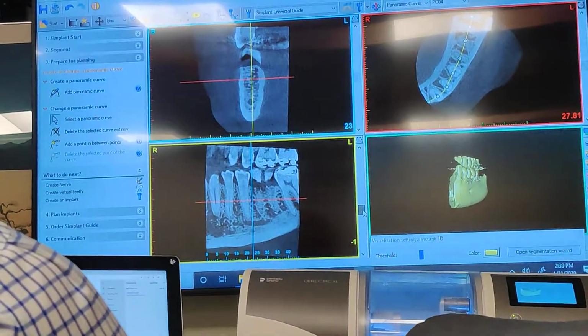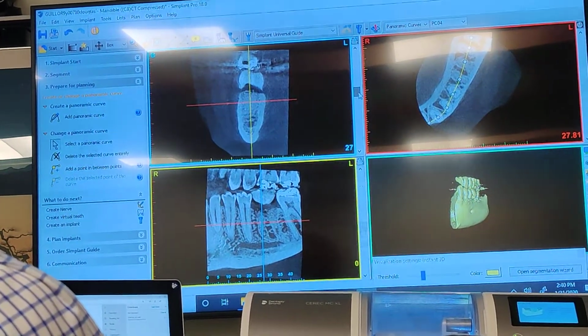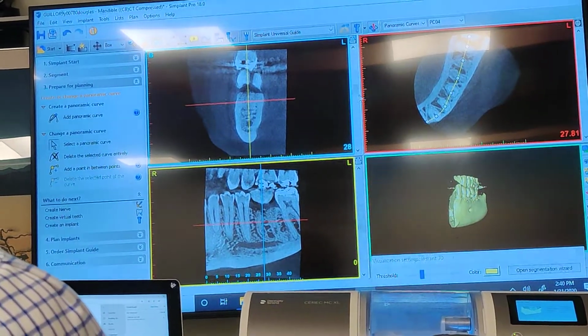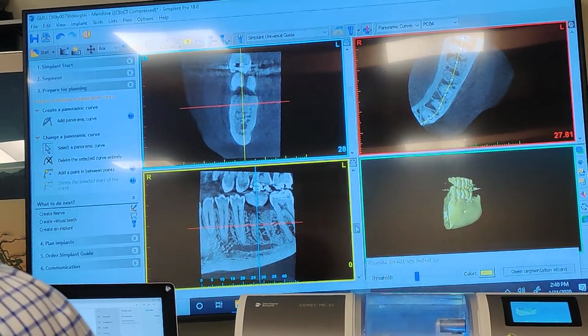Let's set it up mesial distally correct. So I'm in the wrong window. I've got to go to the aqua window and bring this back. Now, I don't know why I can't see. Oh, there's my hole. See my hole? Okay. So there's my hole. Now, let's make sure mesial distally, I'm in the center of my hole.